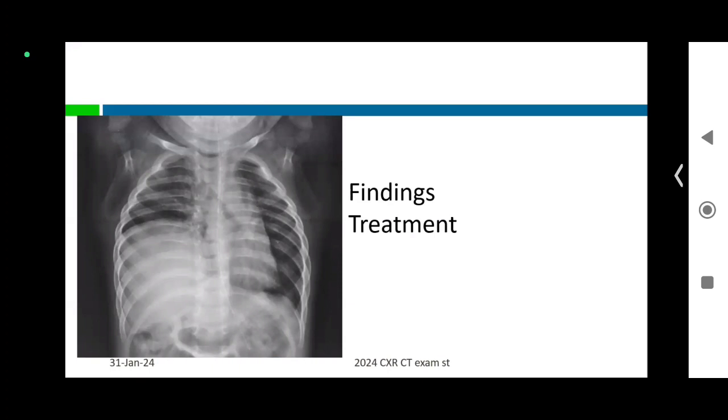Any other DNBs apart from Akhilesh? Sir, right sided pleural effusion, sir, because right side costophrenic and cardiophrenic angles are lost, sir.